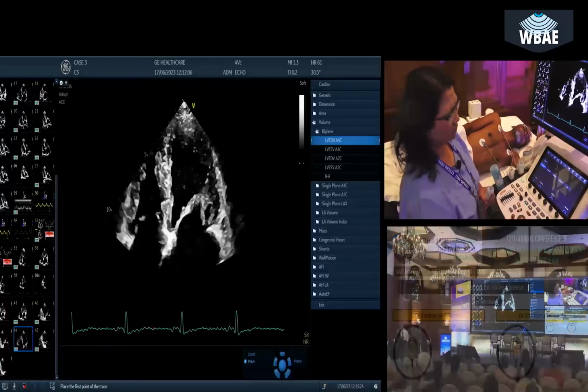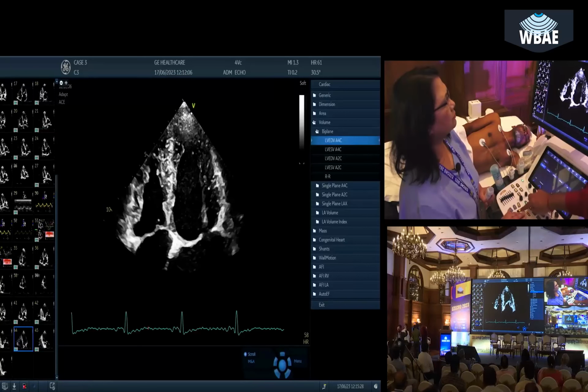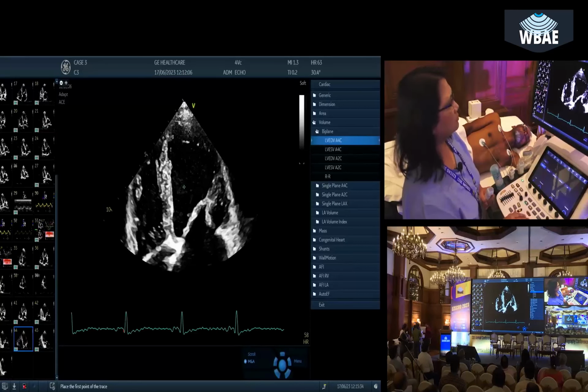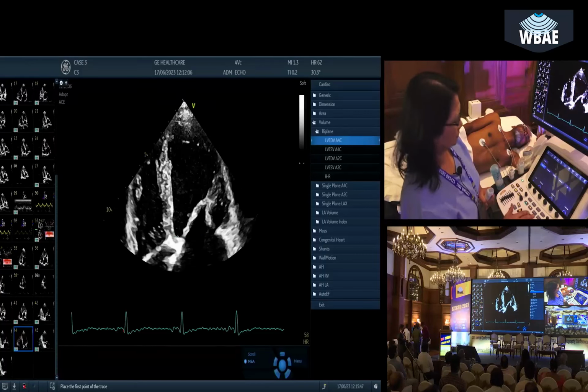Okay, that's fine. So end diastole is the tip of the R wave. You get the end diastolic frame, or you can do it manually. Start from one. Identify the LV end diastolic apical and trace it. No, the other way. Go up. Yeah, you did that.